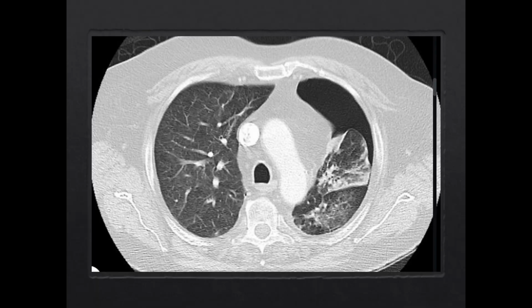You can also diagnose pneumothorax with ultrasound, such as an EFAST, and CT. And CT is really the gold standard, and you can see why. This is a lung window view of an axial CT slice, and you can plainly see the pneumothorax in it. This here on this side is normal lung tissue, and we see all of these lung markings going all the way to the edge of the chest wall.